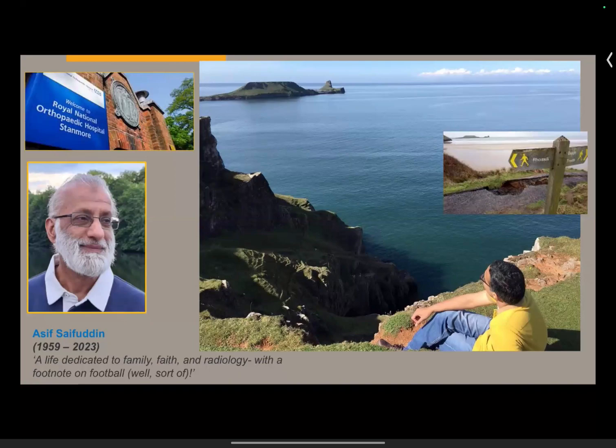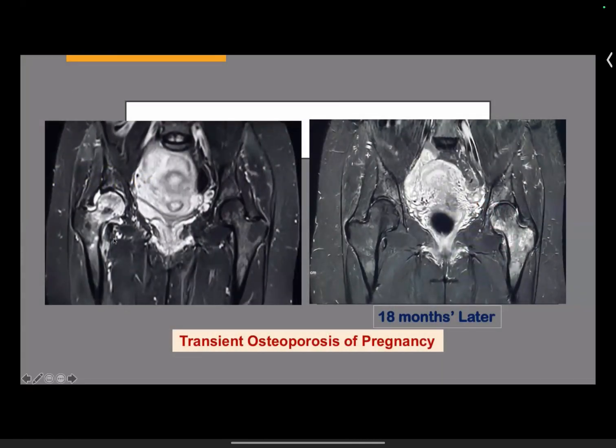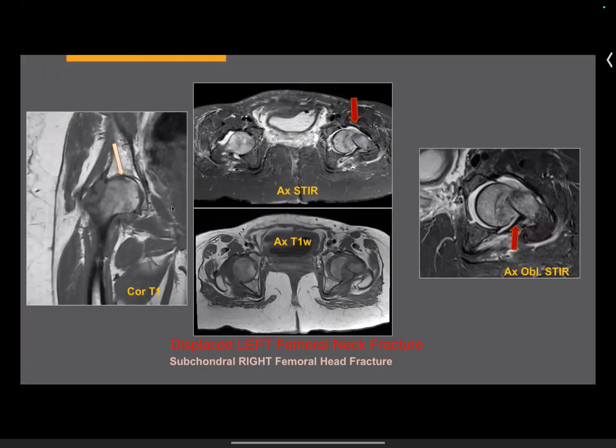The fracture line might be very subtle, like I showed you. I'll put this image there for you. Usually the marrow edema will be much more. If I go back to this one, you see this is what we call a subchondral insufficiency fracture, SIFK, the term we used in the knee. But you can see it in convex bones. Subchondral fractures usually occur in bones which are curved, like the femoral head, the talar head, or navicular for that matter. It conforms to the contour of the subchondral bone, but the marrow edema is much more extensive.